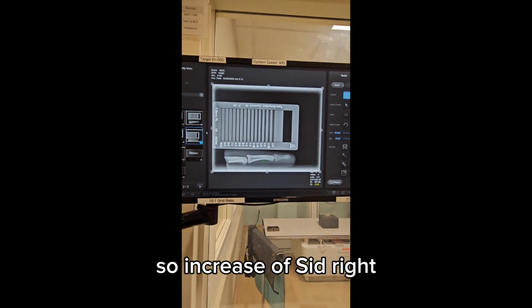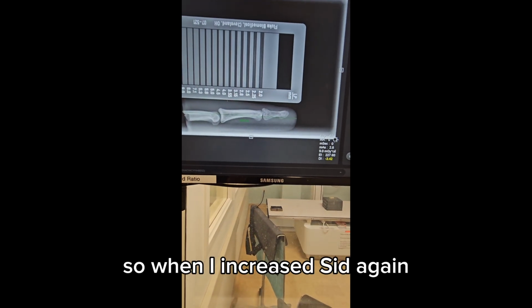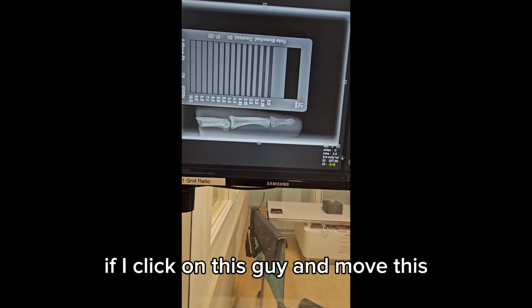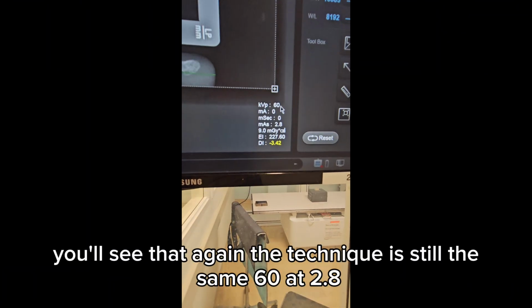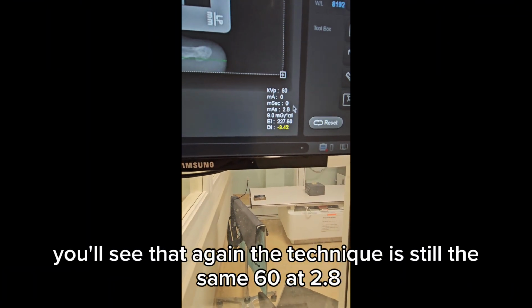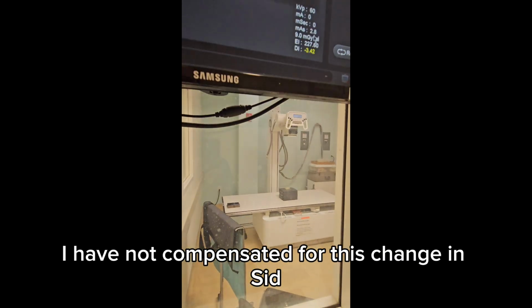So increase of SID, right? So when I increased SID, again, if I click on this guy and move this, we can see it a little bit better. You'll see that again, the technique is still the same, 60 at 2.8. I have not compensated for this change in SID.